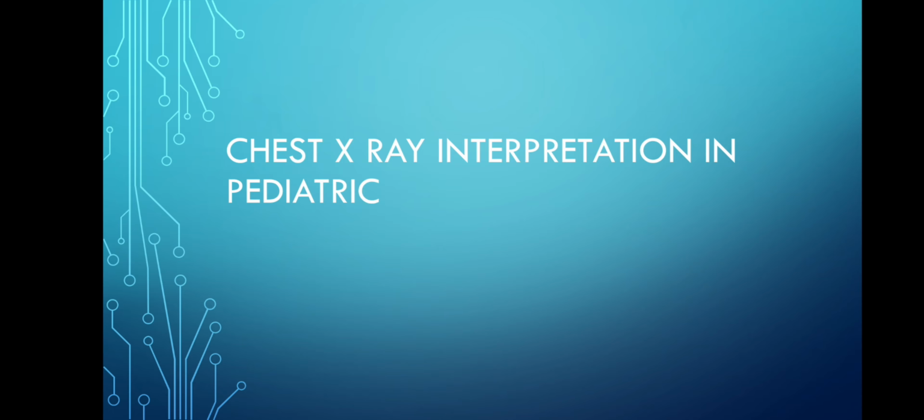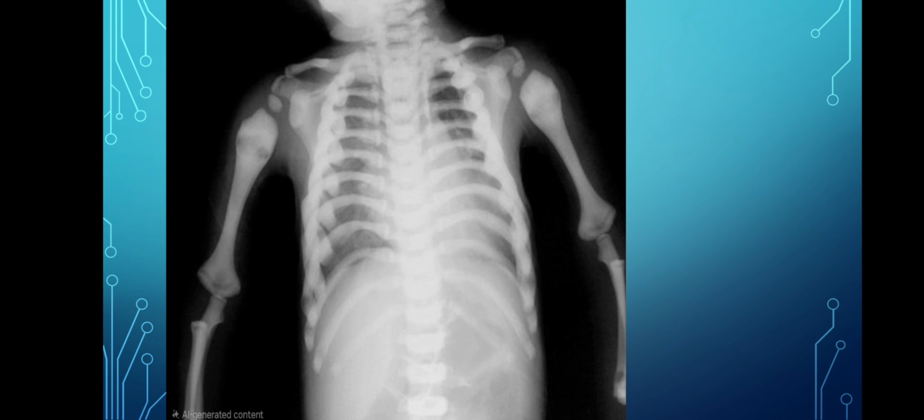Everyone. Today in this video, we are going to discuss chest X-ray interpretation in the pediatric population. In my previous video, I discussed how to describe, diagnose, and interpret a chest X-ray in a pediatric child. In this lecture class, I will discuss the diseases and how to diagnose a disease from the chest X-ray. So let's start with the first chest X-ray.